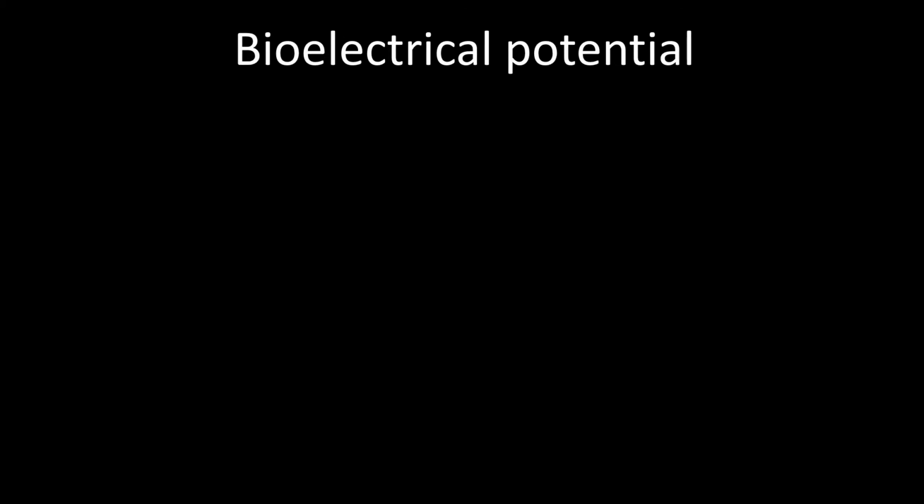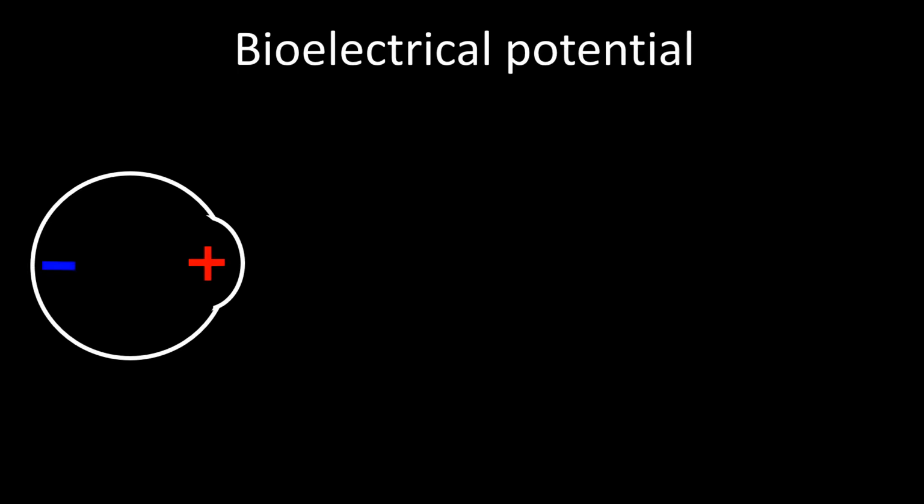One of the most frequent causes of EEG artifacts relate to the eyeball. It is good when thinking eye artifacts to think of the cornea as the positive pole of the eye and the back of the eye, the retina, as the negative pole.